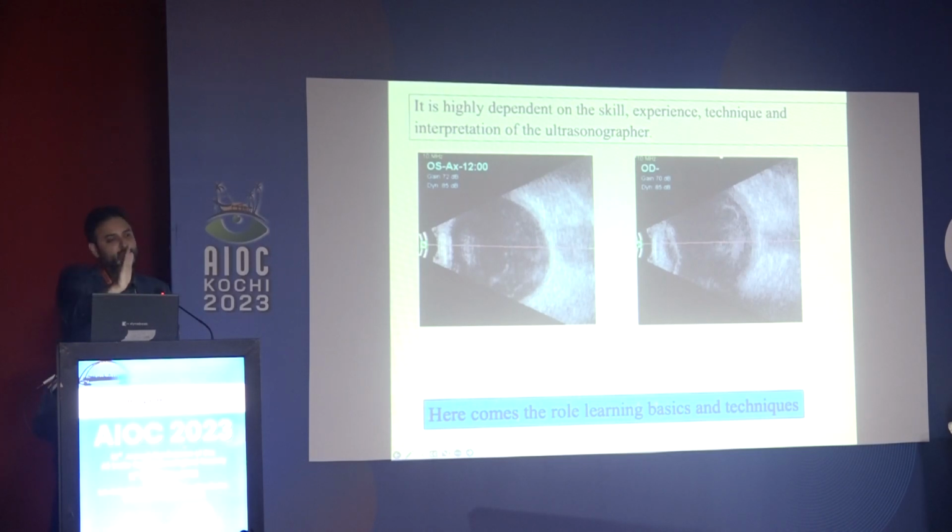It's not like an X-ray where there is a consolidation in the chest. I can see it, you can see it, everyone can see it. So skill is important. Hence, I'm going to try and break this down. And just going to quickly start with the example. Both of these look similar. I mean, there's some point and some dot-like echos, typical ultrasound. What do you think this is?